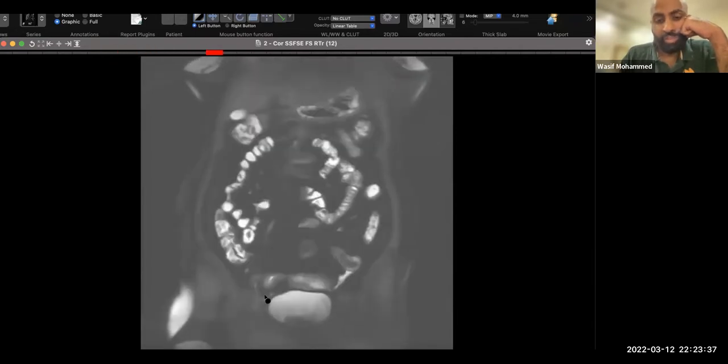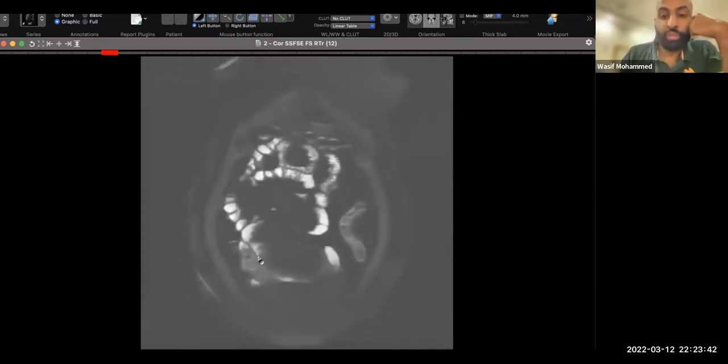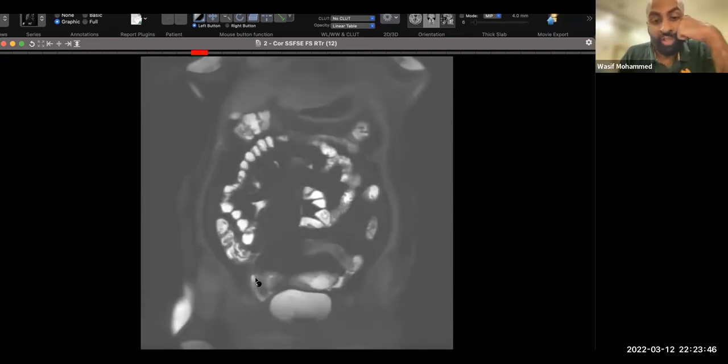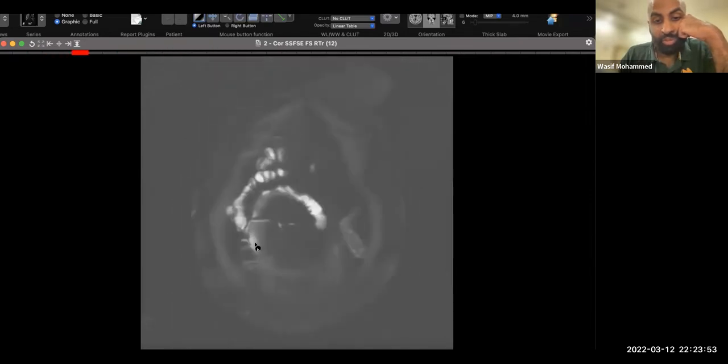It could just be inflammatory fluid. It could be like a focal collection. It doesn't have to be perforation. Perforation would lead to a much bigger picture, or you can say localized perforation, I guess. So just prior to this inflamed segment, there is some focal dilatation. However, the rest of the bowel loops are not dilated.